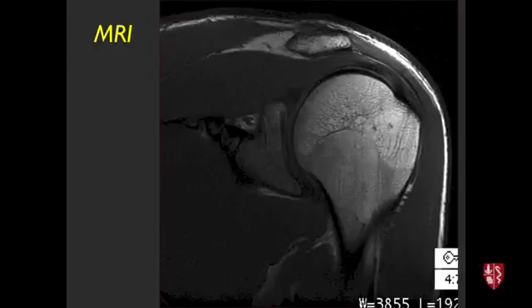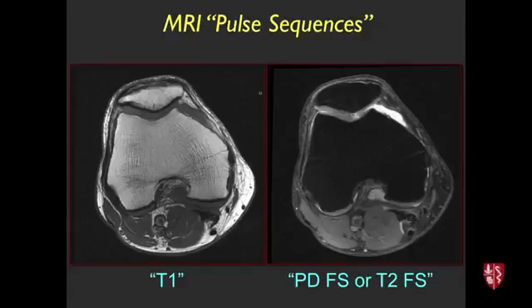Inserting on the bone. And then you also see the fat signal here. So the white on this MRI scan is fat. And so all this white inside the bone, that's the fat that's in the marrow. And that's normal for an adult. And I'll show examples of why this is important in a minute. So tremendous image contrast, very good diagnostic quality because of that.